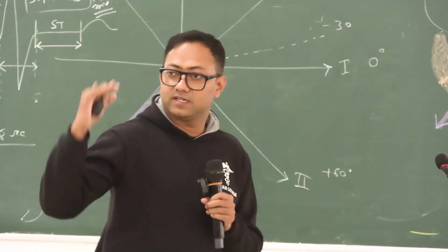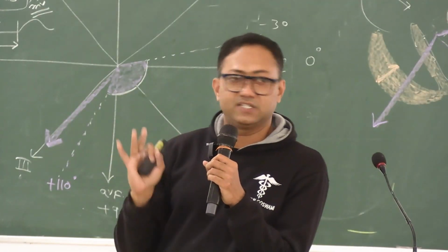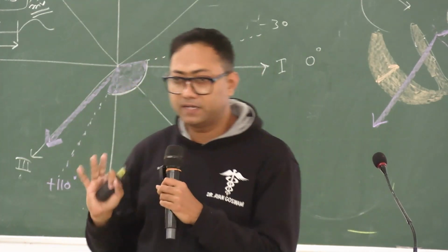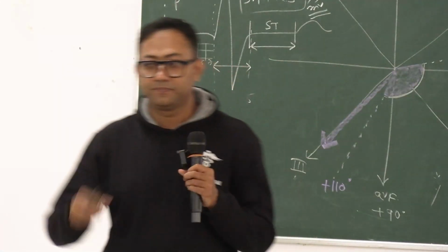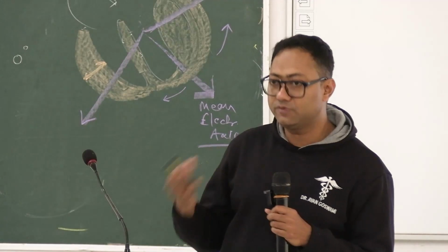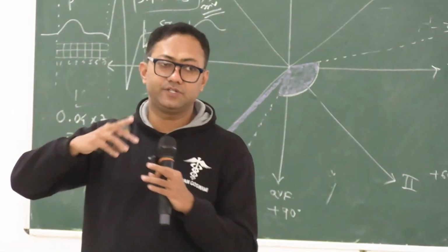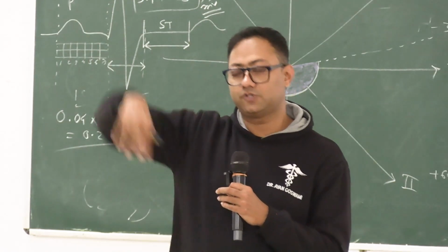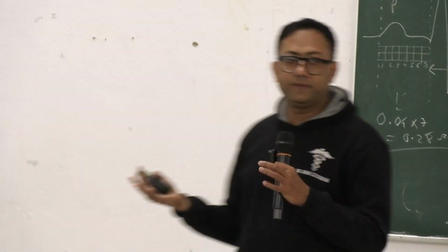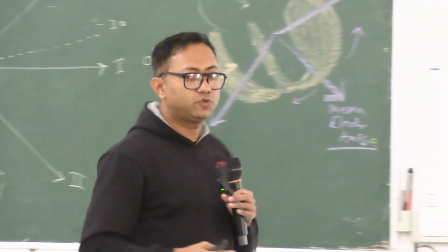So you need to check whether the ST segment is isoelectric at the baseline or not. If it is isoelectric, it is normal. If the ST segment is elevated or depressed, there might be some abnormality and you need to evaluate the patient, right? After the ST segment, you need to check the T wave, whether it is flat, inverted, or hyperacute, meaning the T wave is taller than what is expected. So check the abnormalities of the T wave as well, and finally the QT.